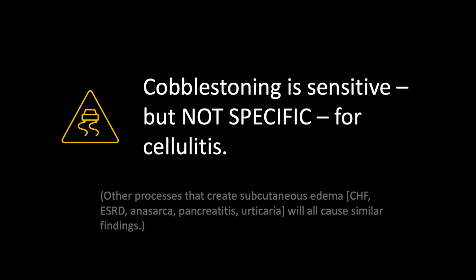Now, it's important to remember that cobblestoning, while very sensitive, is not specific for cellulitis. In fact, lots of different conditions, especially those that result in fluid shifts or volume overload, can also create interstitial edema that generates a cobblestone appearance.